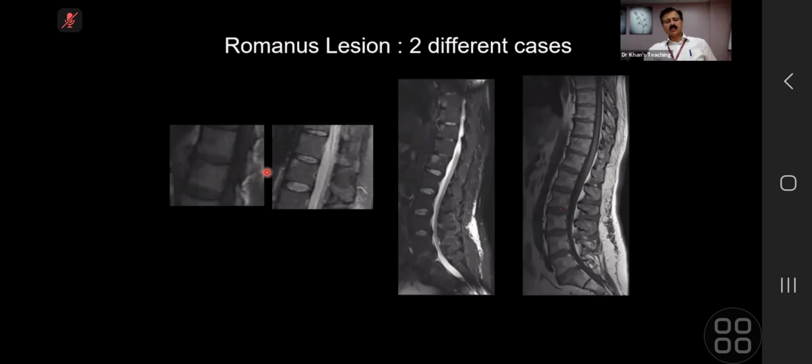Right. So this sign is asked in the exam. This is very important. The concept behind it is that we have an anterior longitudinal ligament going along, and there is inflammation adjacent to it. So at the corner, anterosuperior or anteroinferior, you can find this abnormality. Initially there can be edema there, and at that time T1 will be low and STIR will be high.